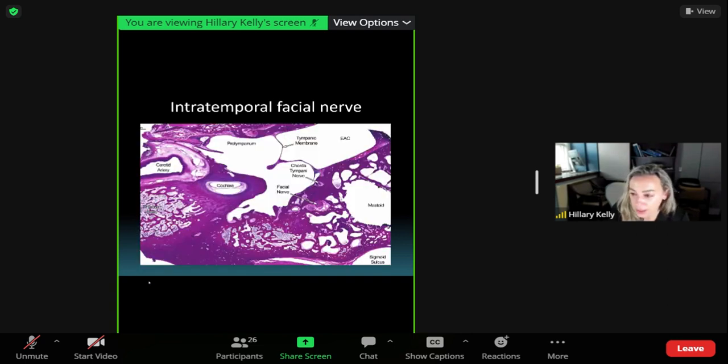And then as you come back here, now we're getting towards the IAC. Here's labyrinthine, here's tympanic.